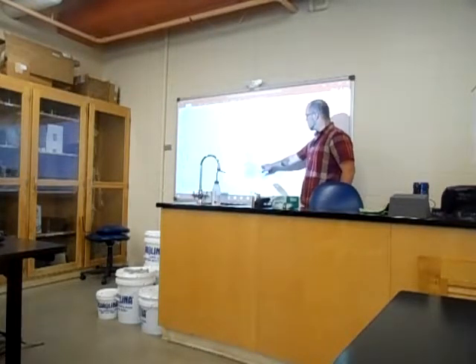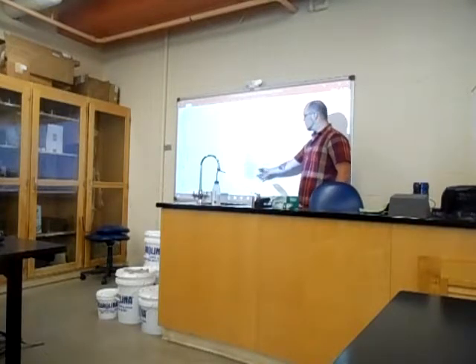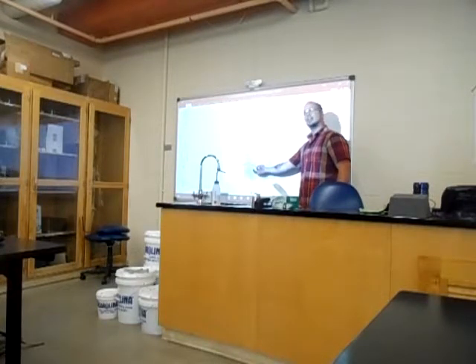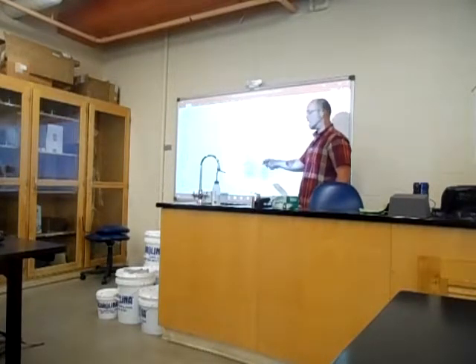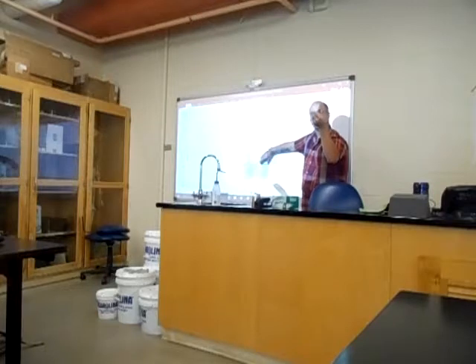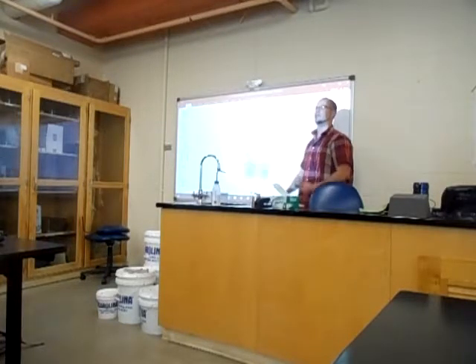So from here to here, this is ventricular depolarization. This is ventricular repolarization. So this is what causes it to contract, and this is when it begins relaxing. So the ST segment is the amount of time when the entire heart is contracted before it begins to relax. And that can be significant too.